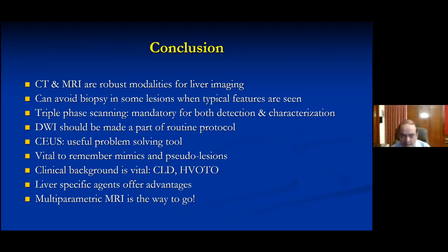So let's talk of HCC versus mass-forming cholangiocarcinoma first. As I said, hepatocellular carcinomas show you non-rim enhancement. It shows you heterogeneous enhancement in the center of the lesion. The cholangiocarcinoma shows you rim enhancement. I showed you that by quite a few examples, that mass-forming cholangiocarcinomas show peripheral or rim enhancement, whereas HCCs show non-rim heterogeneous central enhancement. HCCs show venous washout, whereas mass-forming cholangiocarcinomas have a very rich fibrous matrix and therefore tend to accumulate contrast in the delayed phase. So those are the two things.